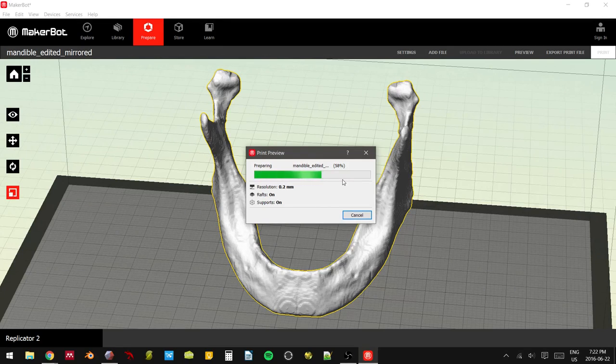It'll get there. This is another one of those get up, leave your computer, and get a cup of coffee moments. Or walk around or whatever.